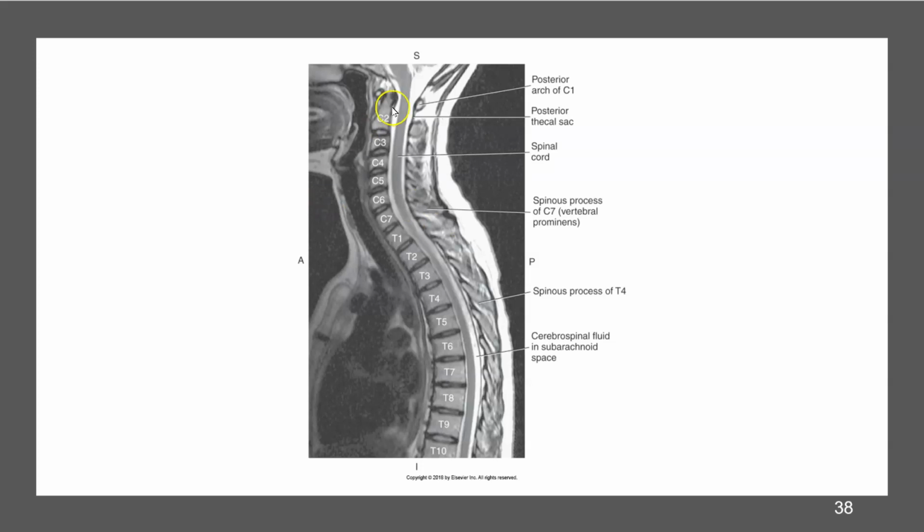So here, you guys always count the spinous processes, and it throws me off. I can't count them, they're too much, as you can see here. Or I can see the bodies really well. So here's C2, 3, 4, 5, 6, 7. C7, T1, joint space right there. You always have to get that, just like when you're shooting an x-ray, we have to do it in CT and MRI also. And then we count T1, 2, 3, 4, 5, 6, 7, 8, 9, and T10.